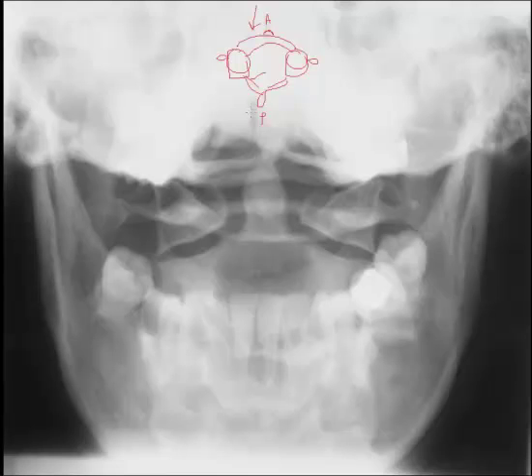So now let's come down to our cervical C1 segment. First I'm going to outline the lateral masses. They look like these wedge-like structures on both sides of the odontoid process. Now, the lateral masses contain articular facets. The superior facet of C1 will articulate with the occipital condyles bilaterally. The inferior articular facet will articulate with the C2 segment. The transverse processes are visualized extending off of the lateral masses like we discussed in our diagram.